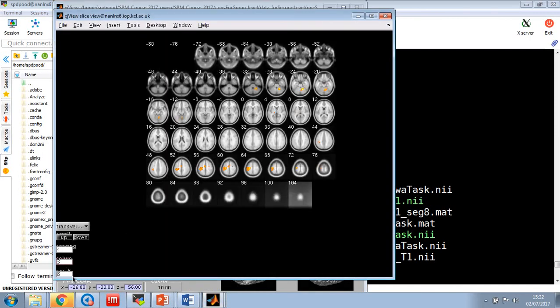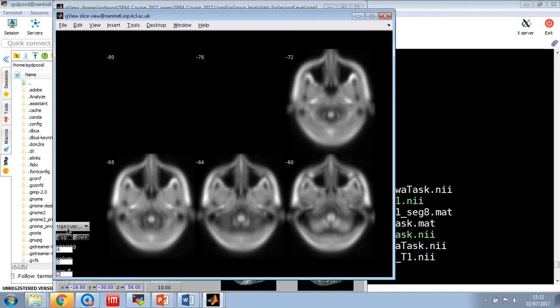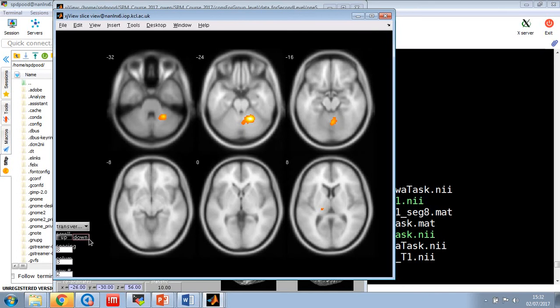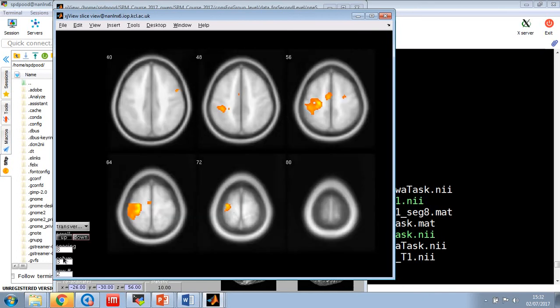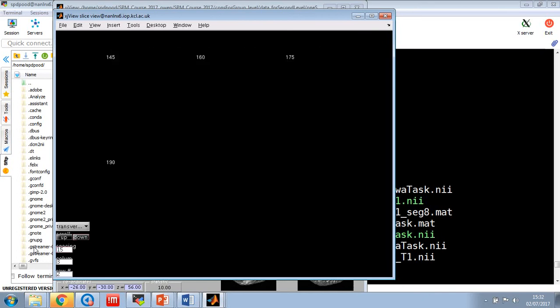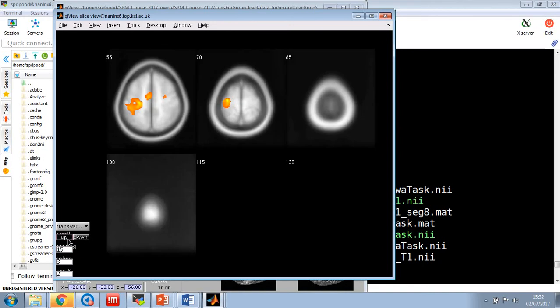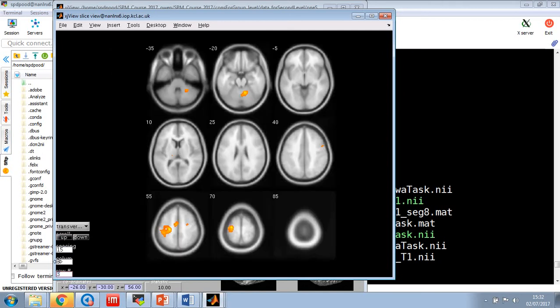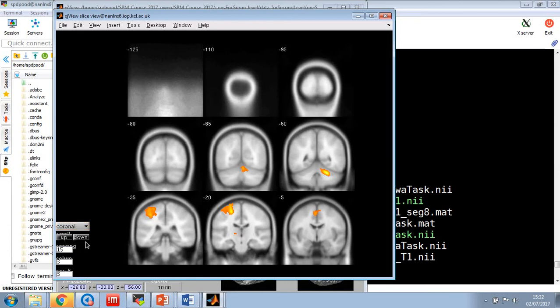So let's say 3 by 2, 2 rows. I'm going to make spacing a little bit bigger, so let's say 8. Let's say set this to 15. Let's say 3 by 3. There we go. Or you can do a cross-section, transverse, anything like that.